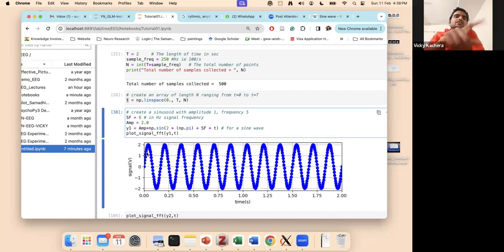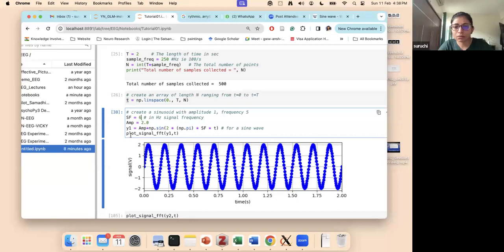So, ma'am, why is it mentioned here like a signal? It should be amplitude instead of signal. Where? On the y-axis. Because the voltage of the signal, it says signal in volt. That's how you will see most of the plots. They're not going to write amplitude. They might write amplitude, but most people will write the signal. So this means signal strength.